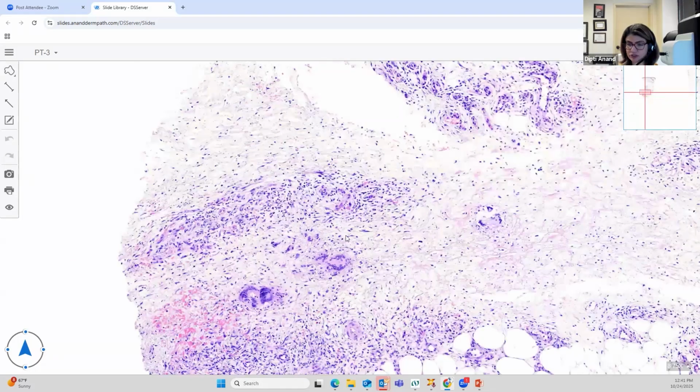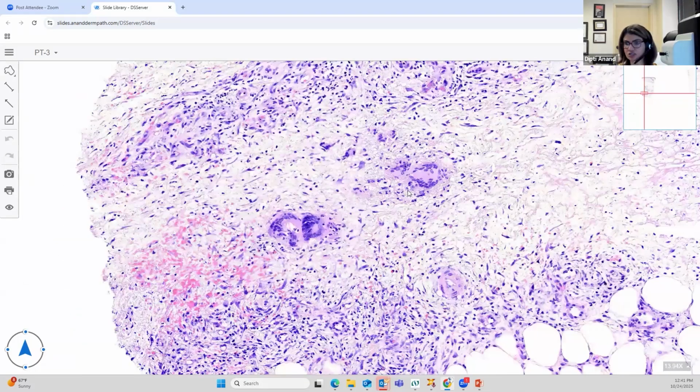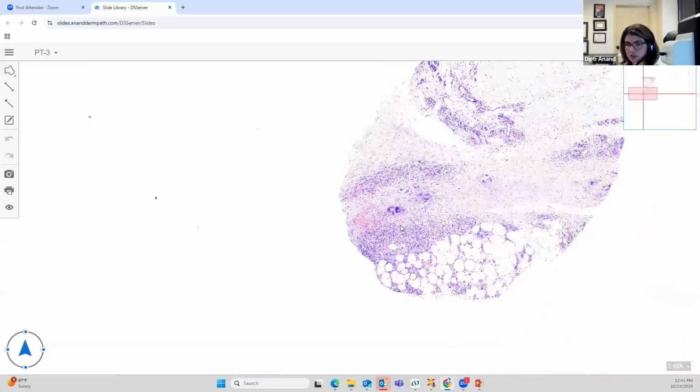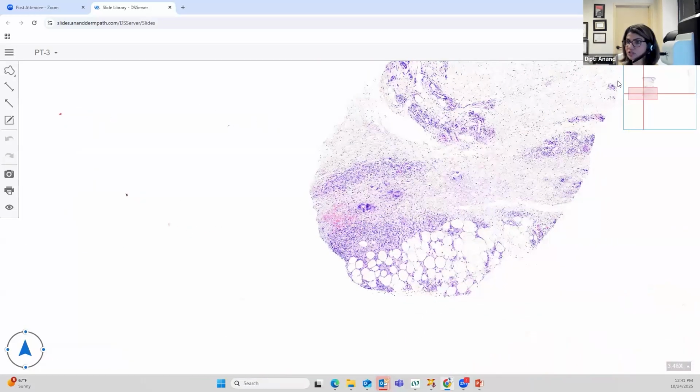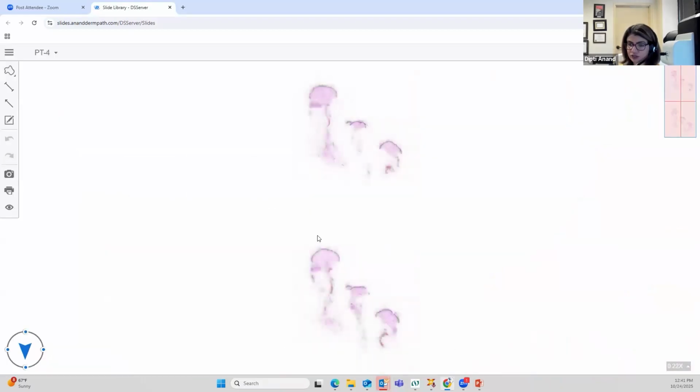So you see septal fibrosis and thickening. And if you see giant cells in the septum, that's diagnostic of erythema nodosum. No other entity will do that. So lymphohistiocytic inflammation, granulomas, giant cells in the septum with septal fibrosis and thickening is erythema nodosum. But you will see a little bit of periseptal lobular inflammation. This is another example of erythema nodosum.